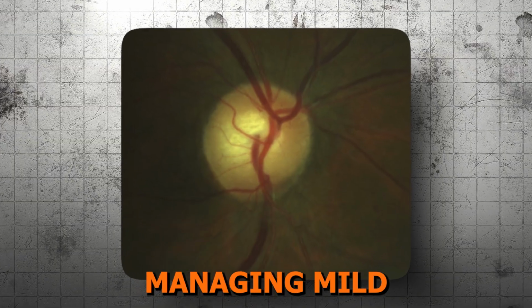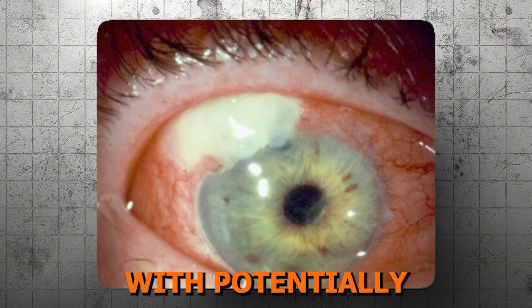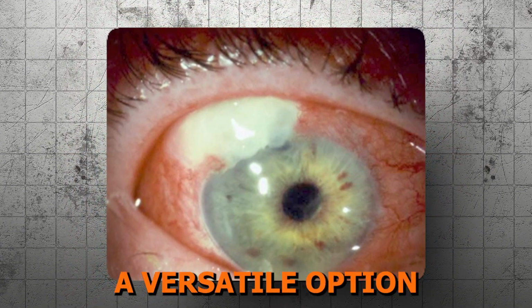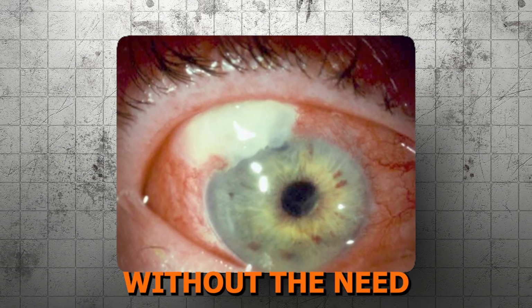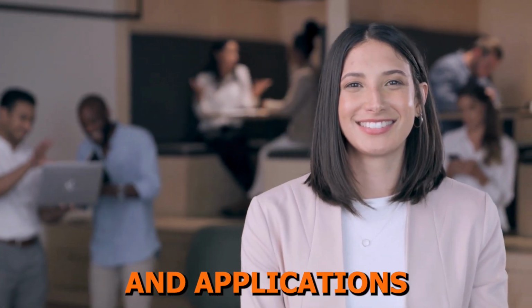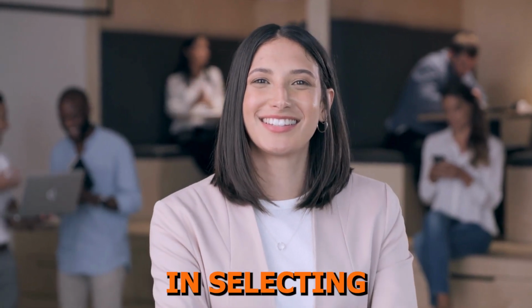Whether you're managing mild to moderate open-angle glaucoma or looking for a technique with potentially fewer postoperative complications, canaloplasty offers a versatile option that helps patients maintain healthy pressures without the need for a bleb formation. I hope this breakdown clarified the advantages and applications of canaloplasty techniques and boosted your confidence in selecting the right tools for your patients.